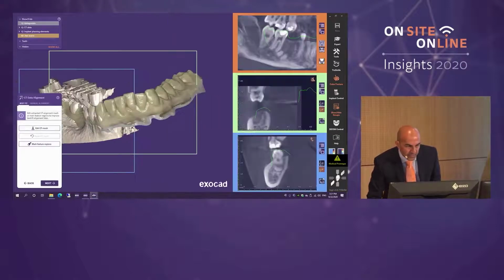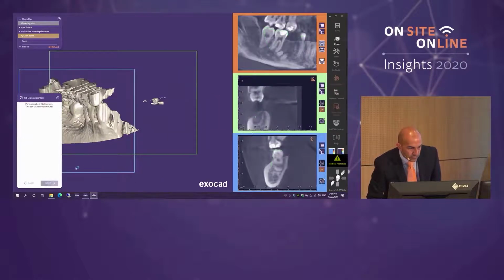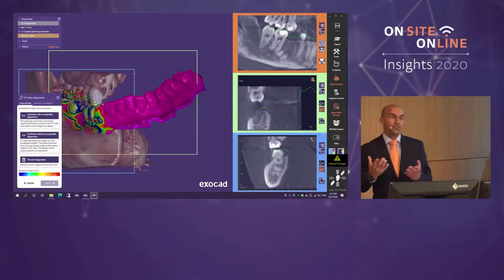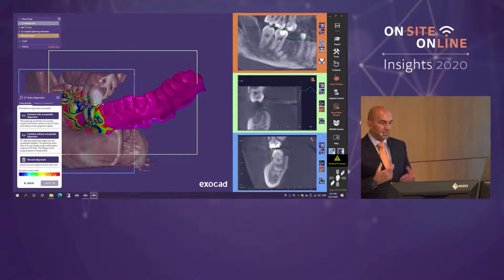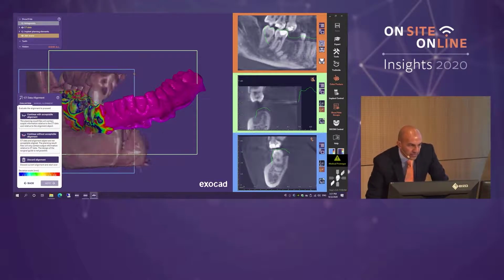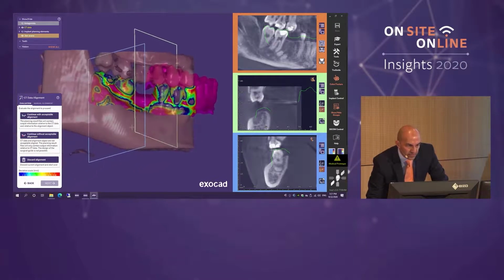When I hit OK there, and then click on next, the software uses what I would describe as heuristics. I mean, it worked really fast there, but it's basically wobbled one model set over the other until it aligned it very, very carefully.